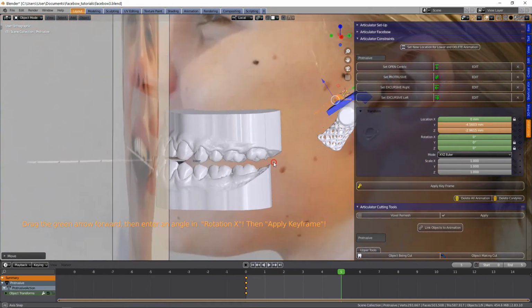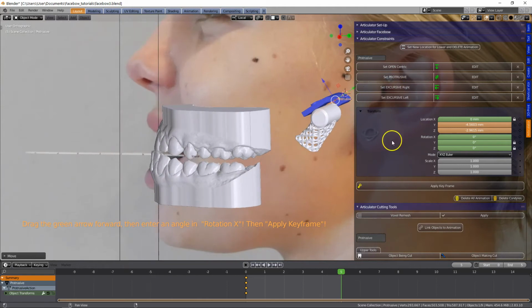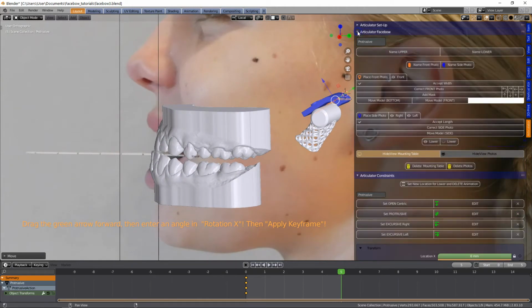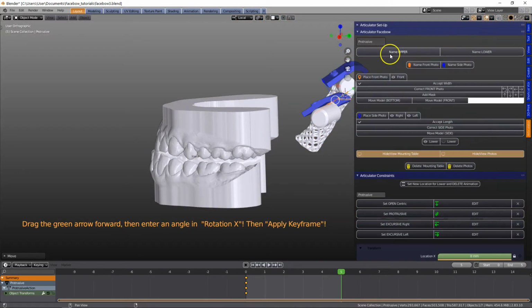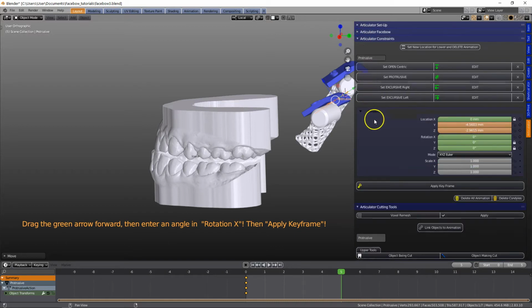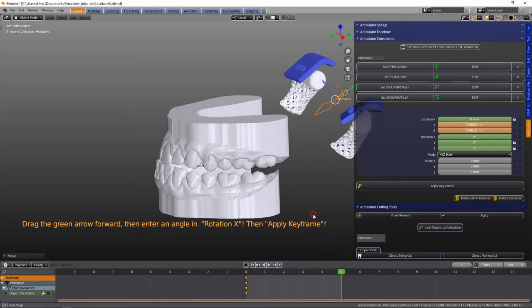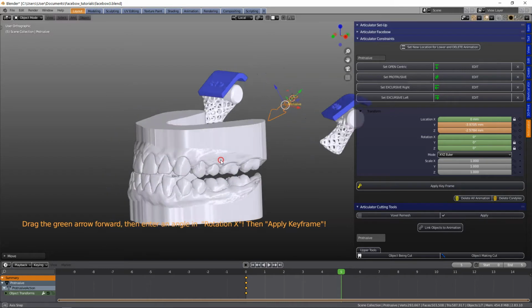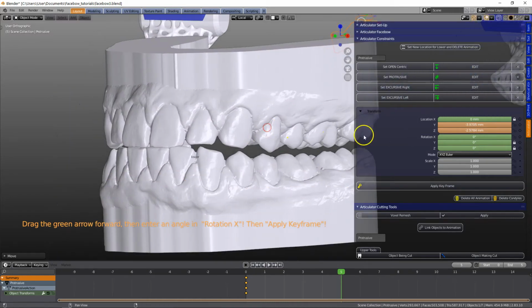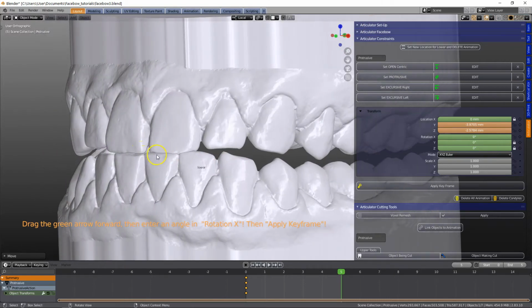At any stage we can hide these pictures so that they are out of the way. So in order to hide that, we go to the Facebow and we can then hide the photos. So here, for example, we've moved the arrow downwards and we can bring it to the edge if we'd like to. But we can notice that the meshes, the teeth, are actually intersecting.